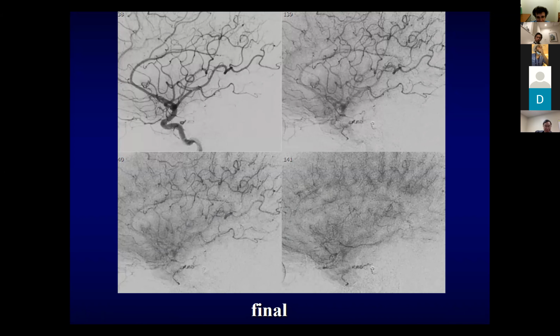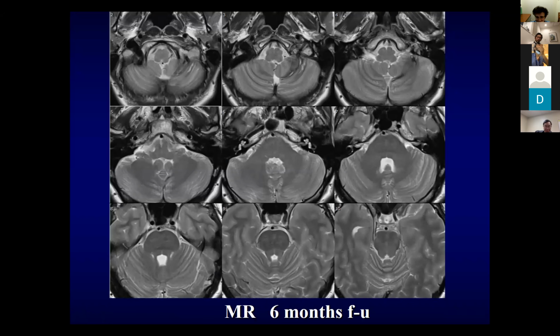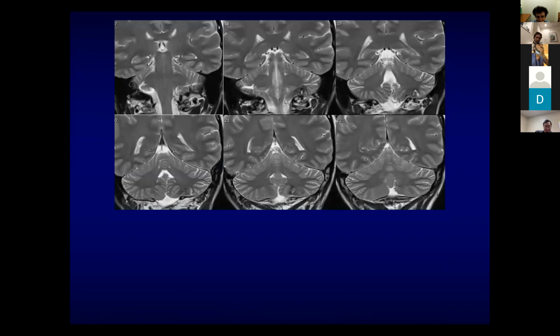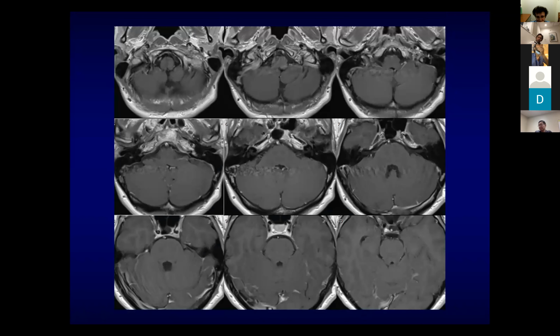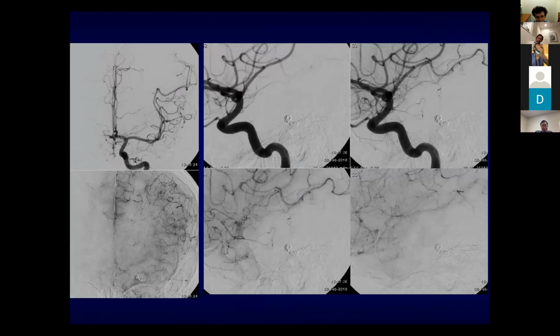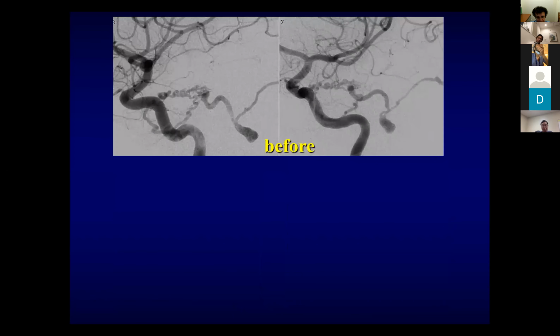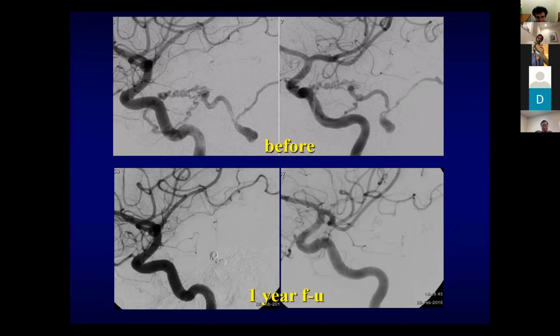This was the final and the CT scan. And the follow-up, of course, the 6 months follow-up with MR, and the 1-year follow-up angiographically with complete occlusion of the fistula. So this was before, and this was the 1-year follow-up.